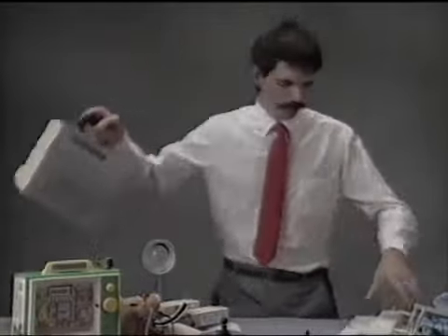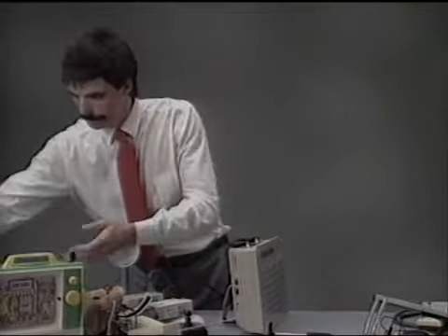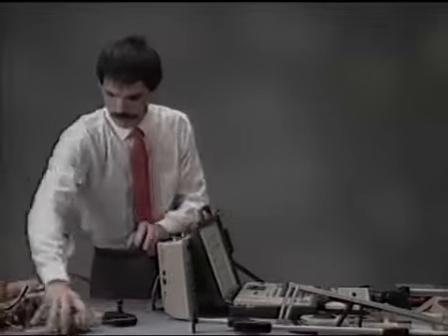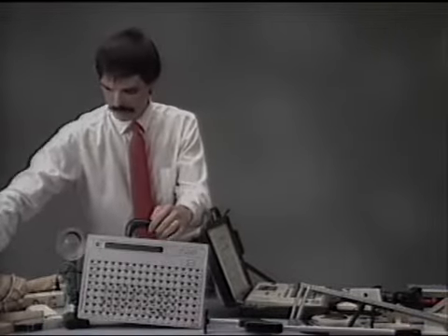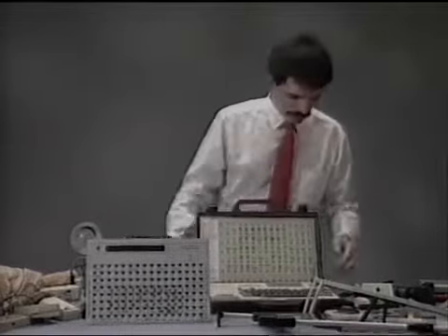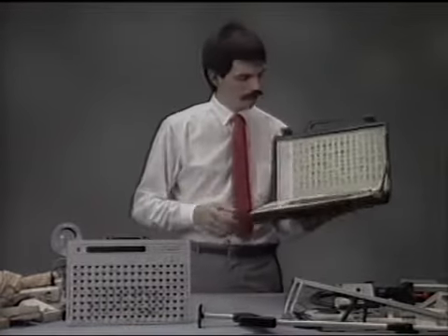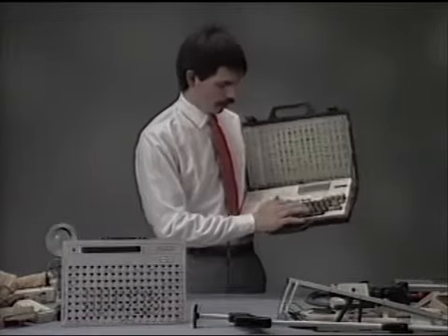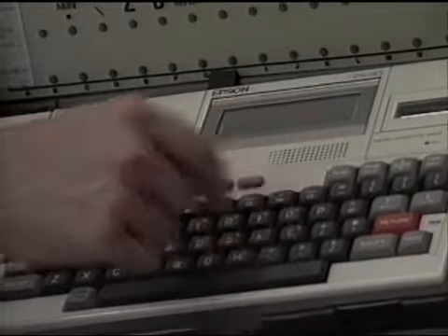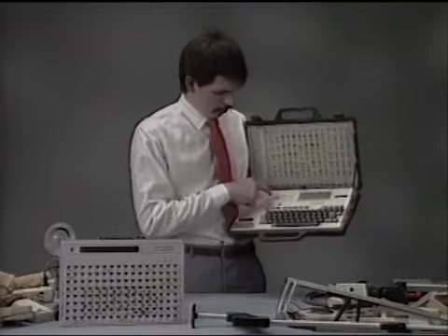Now, I have 2 different ones here, and I'll bring them in and I'll sort of shove this off to the side. Both of these devices are computer-based, and allow me to communicate. Both have different types of voices. This particular one has a female voice, and they're both synthesized speech. Sorry, let me have that say hello again. I can type in the word hello, H-E-L-L-O, return. Hello. And I can have it say the word hello. I can actually print out the word hello.